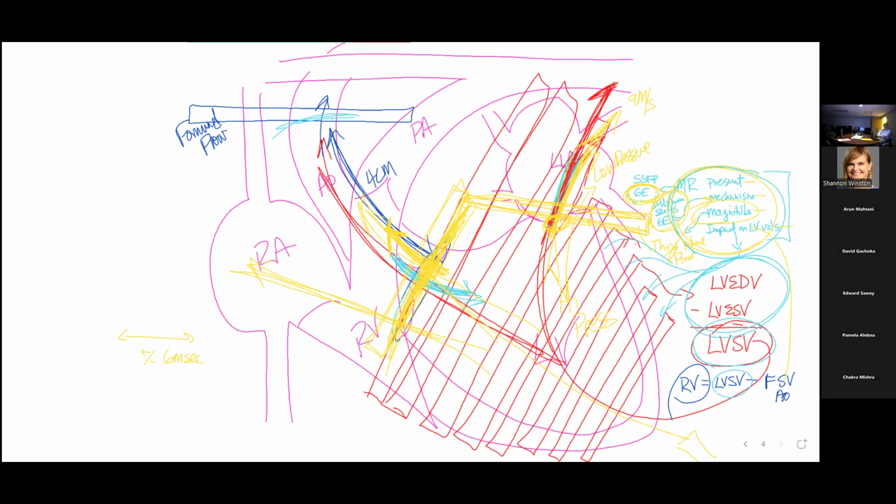And then always use a check. Don't just put one slice here, right? Also do your check, and you have to do that anyway with all these other images and slices because you've got to get the impact on LV volume. Okay, so that's about it for number 3.